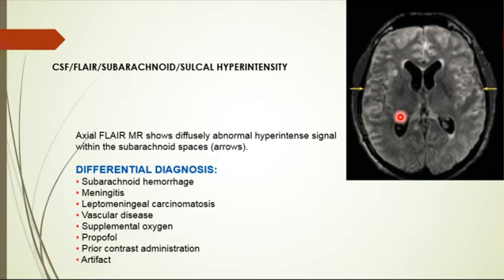For example, one time in my machine, in my clinic, I had this problem exactly. I do coronal FLAIR for the brain as a routine sequence. The last 3 or 4 cuts, always the CSF is there. It's not suppressed for every patient. CSF is there in the posterior part of the brain in the coronal image, and the rest of the brain is suppressed in the front image. So it looks like PRES.